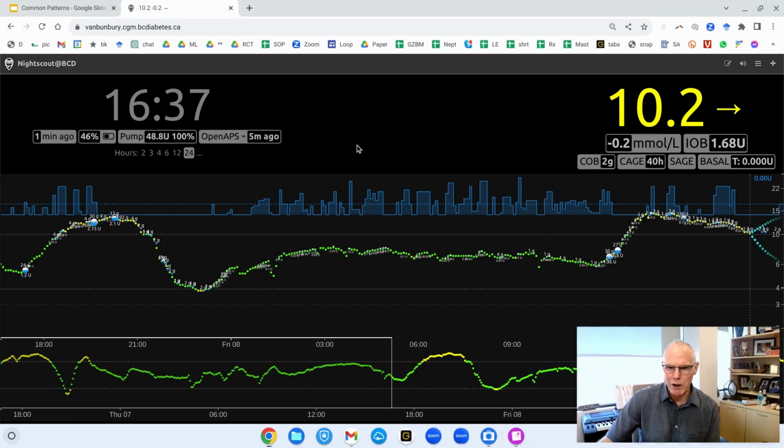So to demonstrate Nightscout, I'm showing you on my screen the live feed of one of our clients. She has consented to it being on this video and kind of gets a kick out of it because she loves everything to do with Loop and its flavors. You can see that it's now 16:38. It's 20 to 5 on a Friday. It's time to go home and have a drink. You can see that her sugar is 10.2.